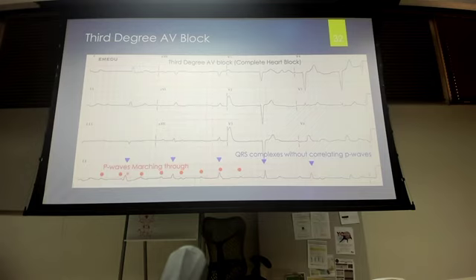So we've got a QRS complex here. It's small in amplitude, a QRS complex here, QRS here, here, here, a little bit bigger here, here. All right. So the first thing we're going to do is look and say, okay, I've got this, and it looks pretty darn slow.